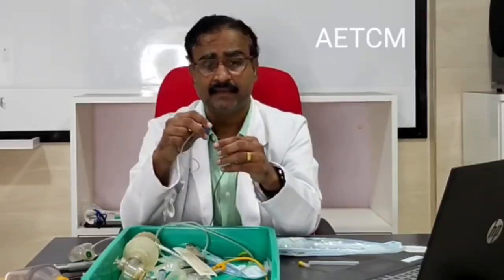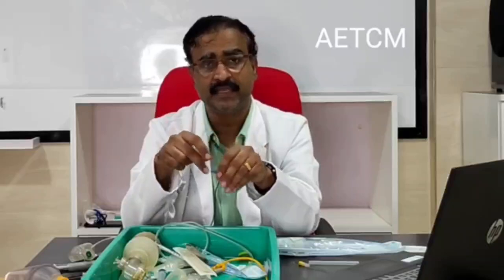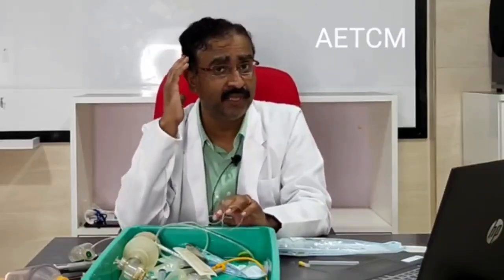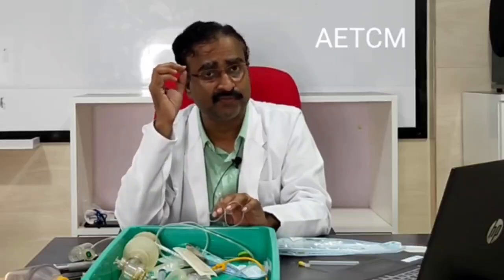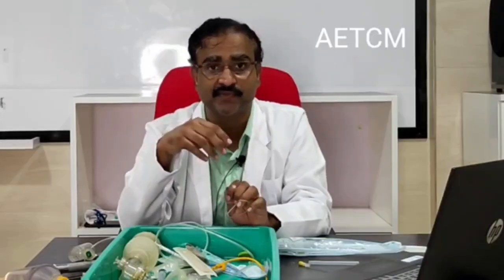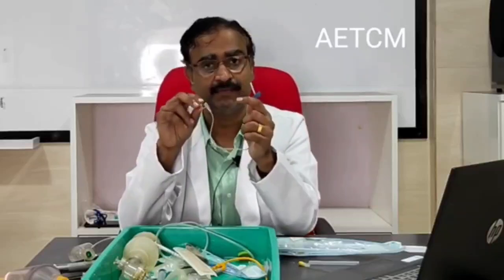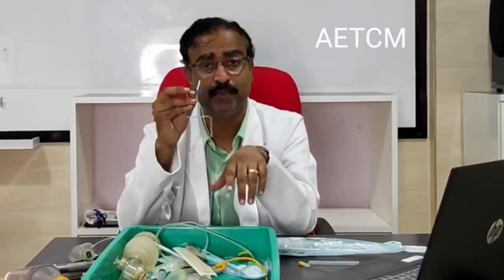In fact, in preterm babies in whom veins are very difficult to get, you may get one on the scalp. You can insert it in some of those very superficial veins and be very successful, because those preterm or term babies will not shake their head much, and this would be very easy to stabilize on the scalp. So this is the use of the scalp vein set.